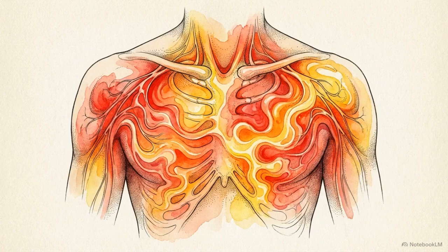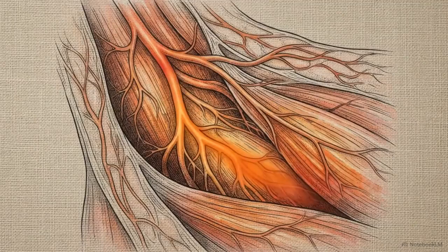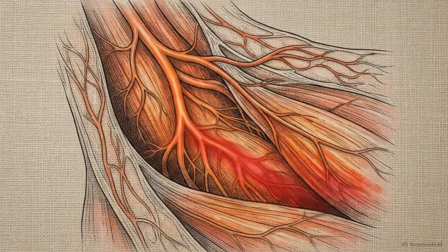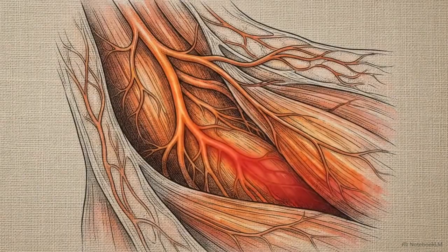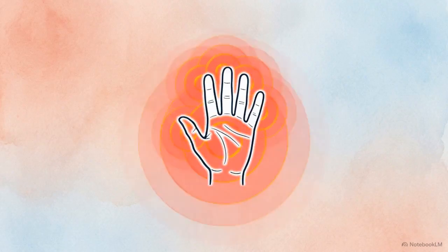Physical therapists are accustomed to viewing the structural integrity of the body through static MRI or CT scans, but this scan captures something entirely different. It is a form of physiologic imaging. Rather than mapping anatomical damage or bone structure, it provides a real-time visualization of active biological processes. The specialized camera used to capture this scan detects the natural infrared radiation emitted by the human body, which occurs in direct proportion to its surface temperature.